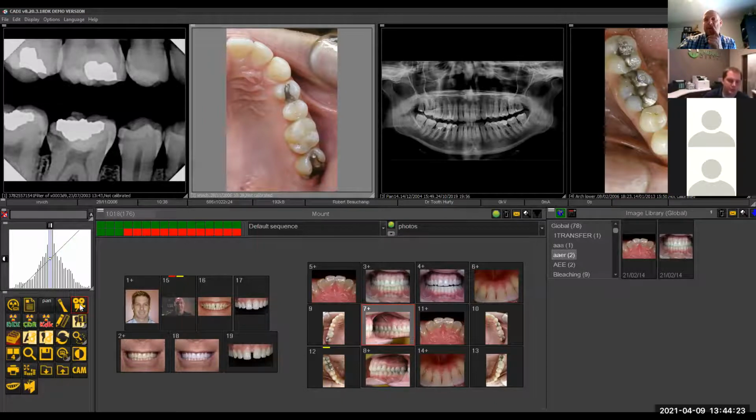I'm sorry, interrupting again. Can you grab freeze frames out of a video with this software?